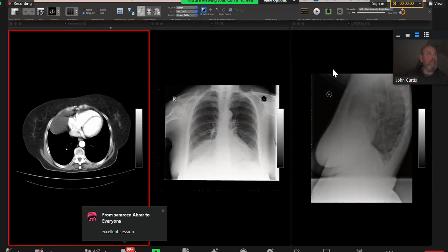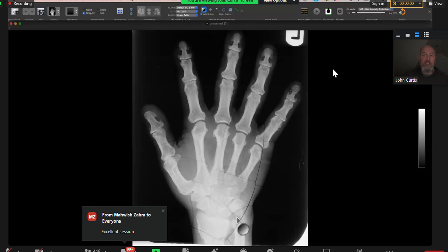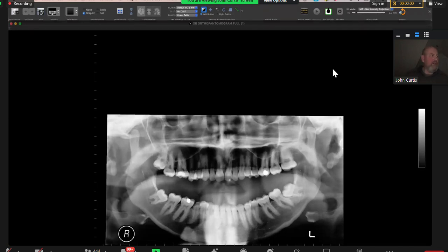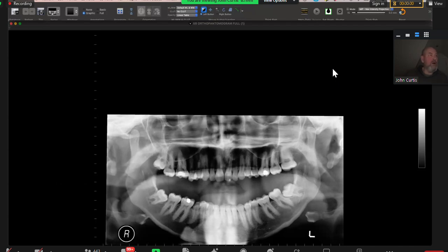Acromegaly: spade-like terminal tufts, massive hands. You sometimes see TFC calcification, not in this case. Widened joint spaces. The patient is asked to clench their teeth, and this patient is not clenching the teeth. And so this is a dislocation. It's either unilateral or bilateral, but this is dislocation of the TMJs, to open the jaw. Yeah, you smashed this one.